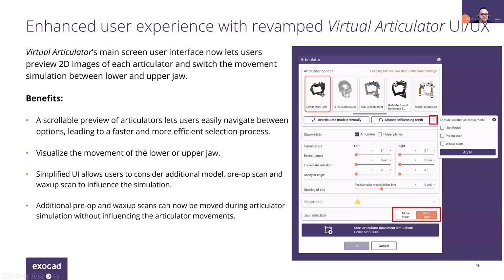And with the simplified UI, there are also considerations for the model scans, pre-op scans, and wax-up scans to influence that articulator simulation.